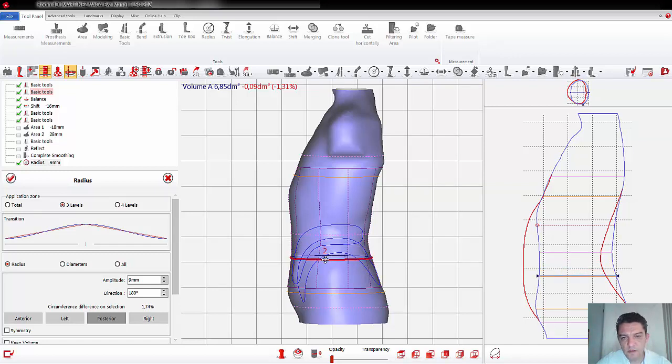Okay, I think it's much better. And let me look now. The volume is between this point and this point, it is more or less okay. Okay, so I want to leave something like this, and after I will build up on the axillas, the ML.